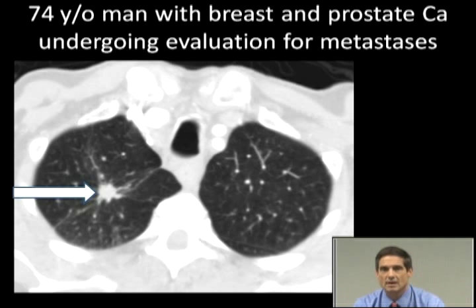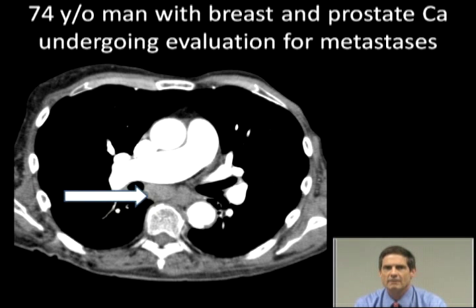This is a cut that's done more inferiorly on the patient and shows additional abnormal lung density compatible with tumor, marked by the arrow. And finally, this poor gentleman even had mediastinal nodal metastatic deposit in these prevertebral nodes behind the right pulmonary artery, marked by the arrow there. The soft tissue densities are abnormal metastatic deposit in lymph nodes at that location.